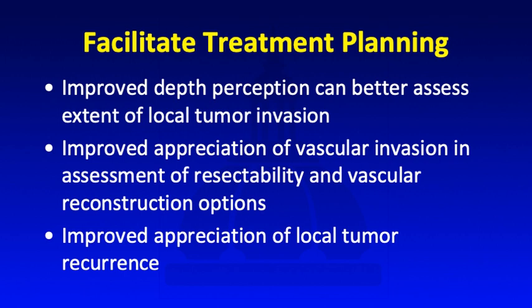And when we show these cinematic rendered images at tumor board, the surgeons really love it because they feel like this improved photorealism can really help them imagine what it's like when they open up the patient, and it helps them with treatment planning. And a lot of times with pancreatic surgery these days, it's not a binary decision whether someone is a surgical candidate or unresectable, but there is a lot of gray zone in the borderline resectable category. And having these images can help surgeons decide whether to take some of those more borderline cases to surgery and how they would do any vascular reconstructions.